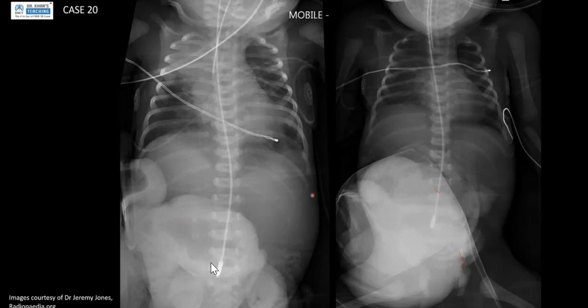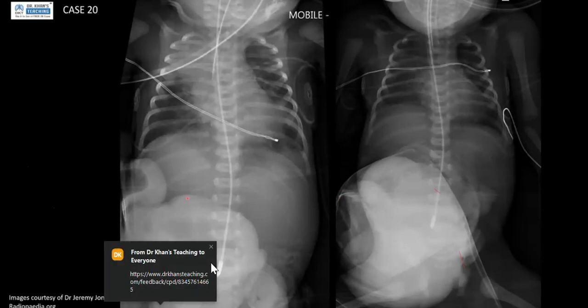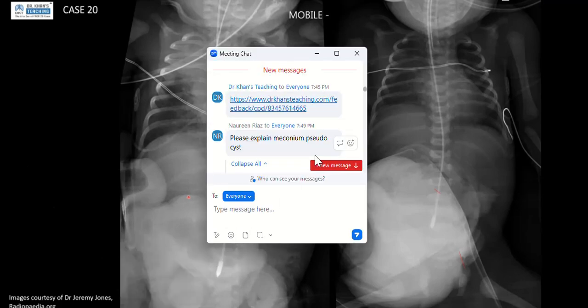Okay. Other than the stomach gas, I don't see any bowel gas in the abdomen. There's a lack of rectal gas as well. So maybe the stomach seems continuous with the structure on the right side of the abdomen, which could be external from this patient's abdomen.